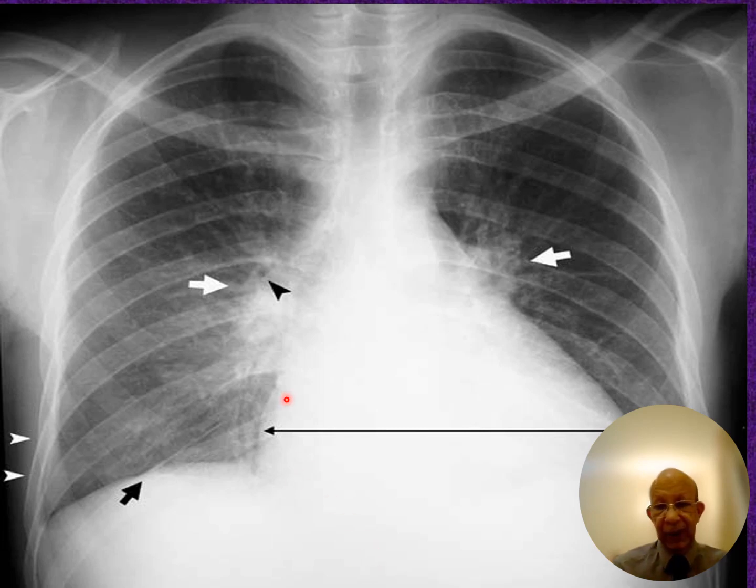Now this is just a typical X-ray of a broken rule of a cardiothoracic ratio of less than 0.5. And obviously, if you can see here, these hila are highly engorged. They are not concave, so they are really engorged, and most likely these are engorged vessels. And there is some cephalization or upper lobe venous diversion, and possibly blunting of the costophrenic angle there. And these are actually Kerley B lines. So the picture is a classic pulmonary edema.